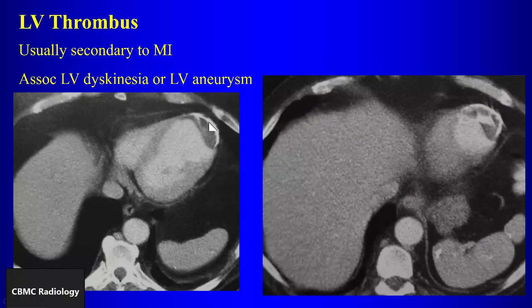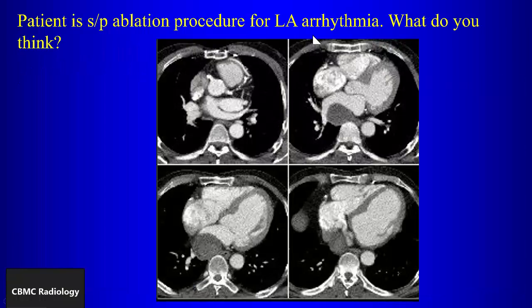So here there's calcification of the apex from a true aneurysm, and because of the abnormal wall motion, this is a common location also to develop thrombus. Chronic thrombus can also calcify, so you might also see calcification within chronic thrombus.